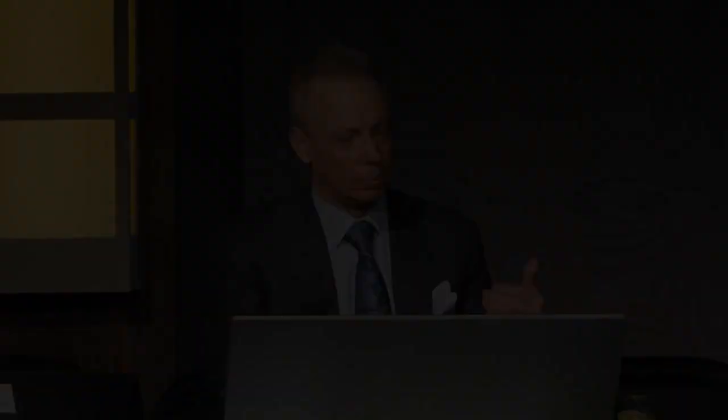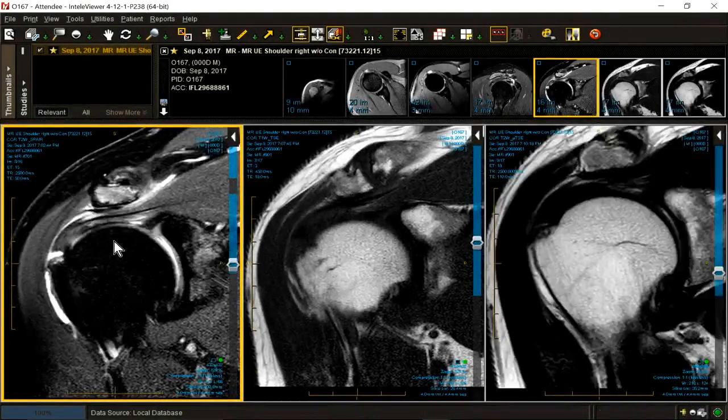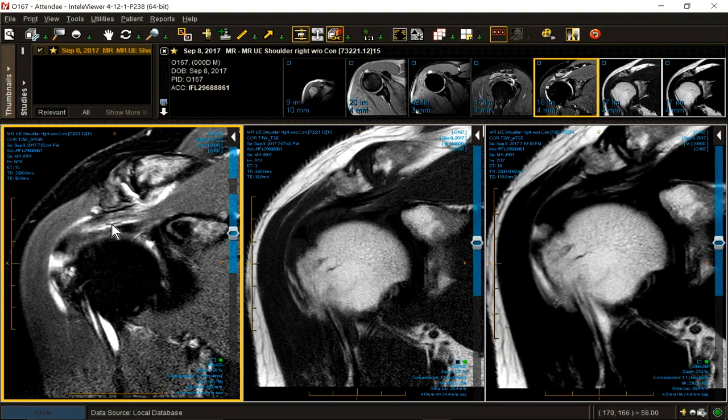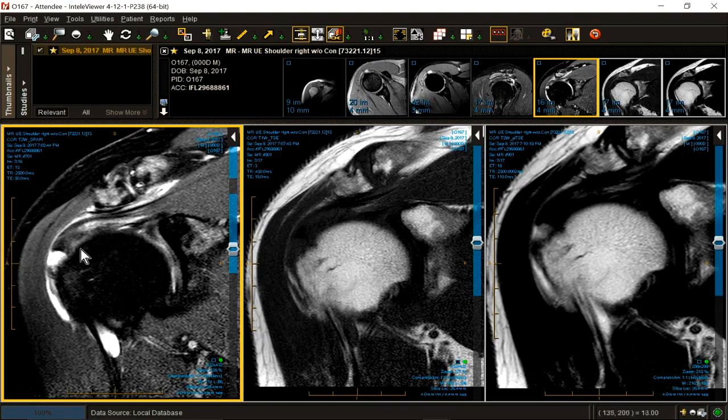But the impingement is a lot worse when the arm is up like this. There's even impingement when his arm is lying down at the side. So here I would describe subacromial, morphologic, bony, and ligamentous impingement associated with diffuse tendinopathy with interstitial extension and a full-thickness avulsion footprint tear.